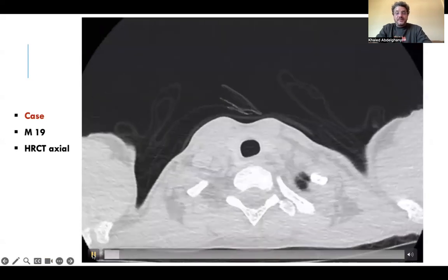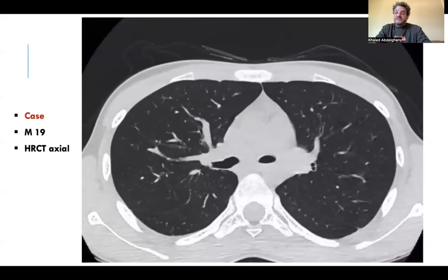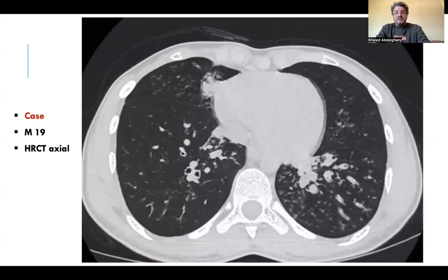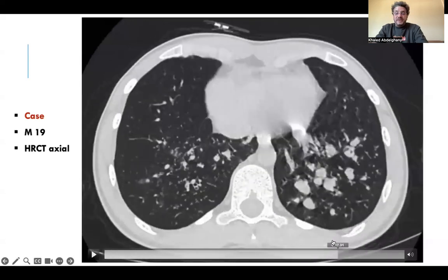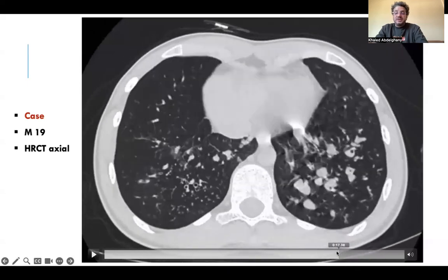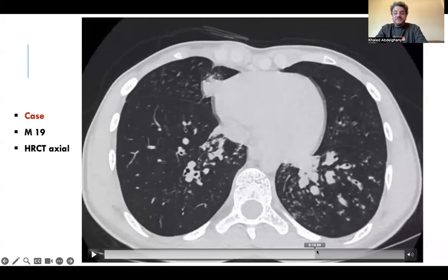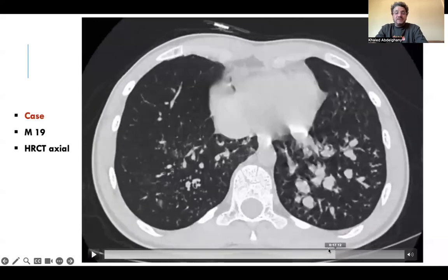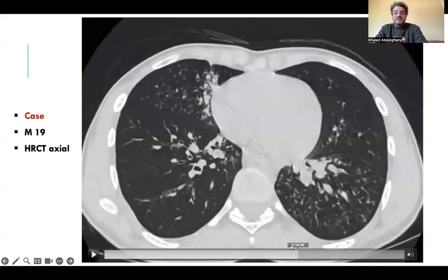are four entities: primary ciliary dyskinesia, primary immunodeficiency, cystic fibrosis, and Young syndrome. As you see here, we have lower lobar predilection for tree-in-bud, branching opacities, mucus plugging. We have bronchial wall thickening, bronchial dilatation, yet no obvious bronchiectasis. We have to be conservative in description of bronchiectasis. We limit this description in bronchi with lost tapering. Until now, these are signs of infection.